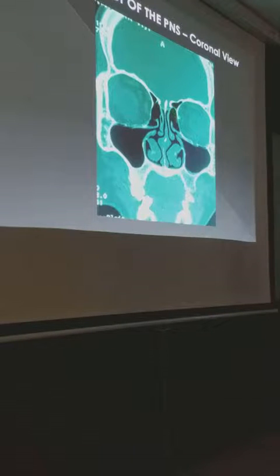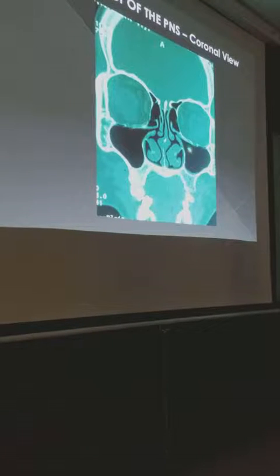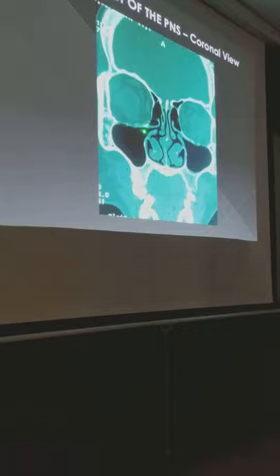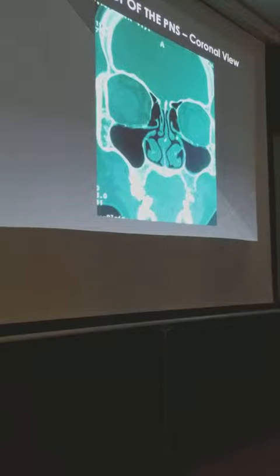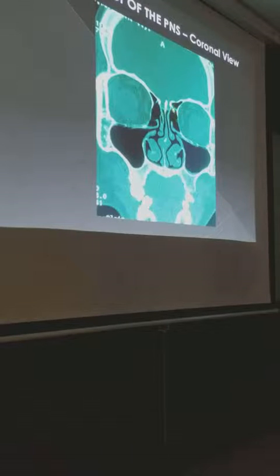What's that? This is the orbit. This is the anterior cranial fossa. So this is the orbitocranial canal, which transmits what artery? Because you are where? You are in the anterior group of cells, right? Okay? So there. This is very unusual because normally it hugs the skull base, along the fovea, the dome, along the roof of the ethmoid. Here, it's hanging by a mesentery, as you can see. So always be cognizant of that.